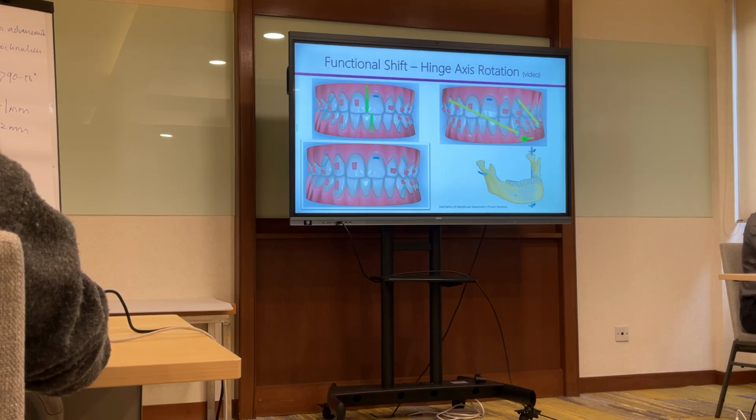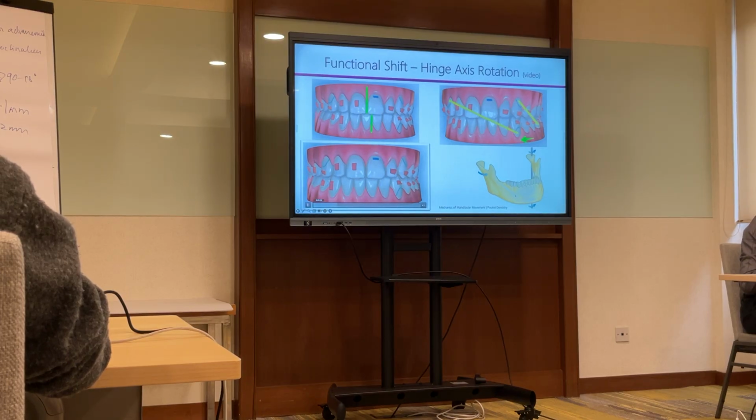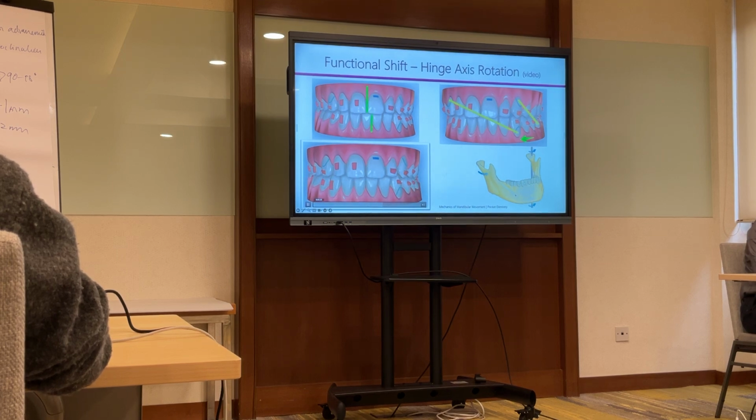For example, if you use class 2 elastics, in the setup, you will see all your teeth are getting straighter. In the end, you will see a jump, where it's telling you that this is what you should expect to finish because teeth are moving forward. Okay? That's how your jump works. You see this video? Can you see the jump? That's how the jump works. In one stage, you will see the whole thing gets centered. And these anterior cross elastics can also be used on aligners.